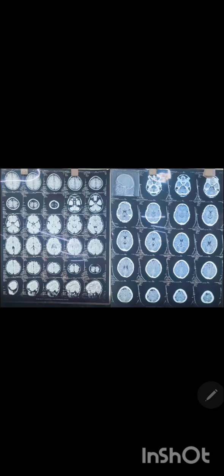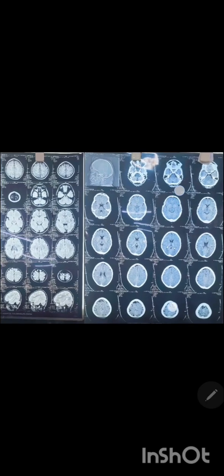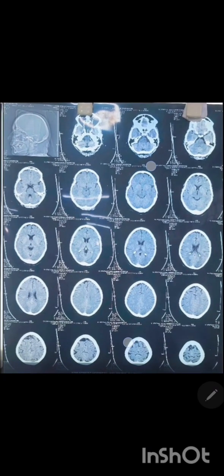In CT scans, computed tomography, it is usually a type of X-rays used to create fast cross-sectional images at different levels of the brain, from the top sequentially to the deep layer, making them ideal for different conditions during emergencies.